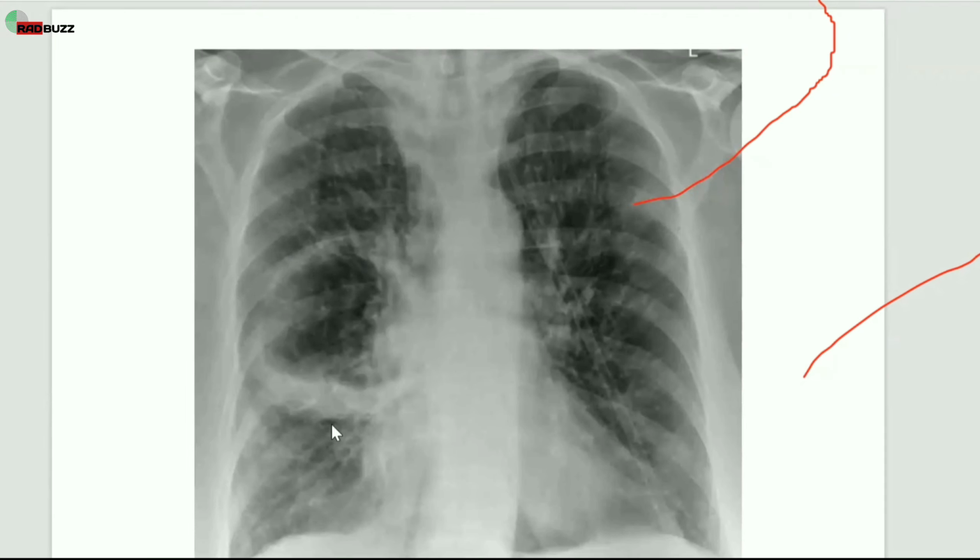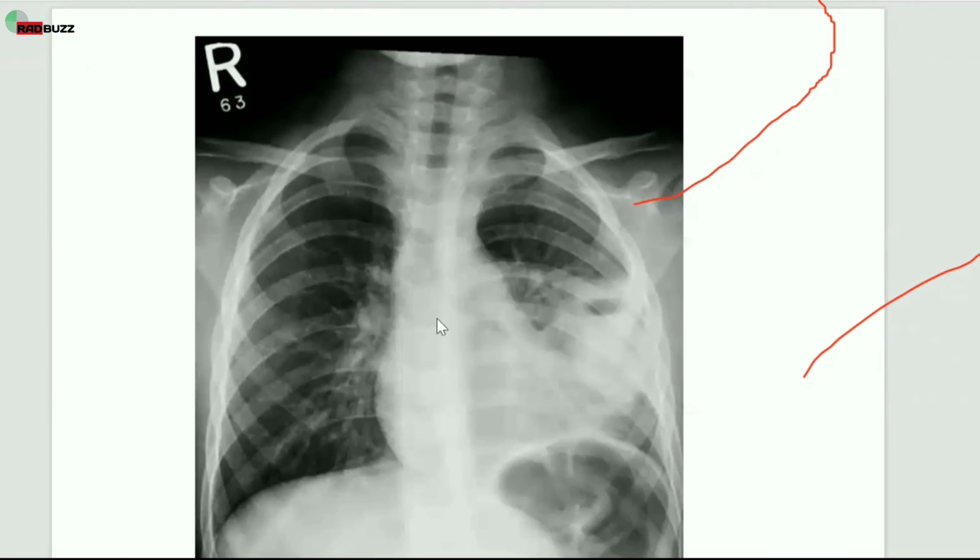Here we have again a well circumscribed lesion. We can see thick walls, and there's an air fluid level within it. An abscess will give the same appearance. They can be big. This whole lesion is an abscess, and we have a smaller internal air fluid level. Peripheral walls are thick, more of pus, and a small air pocket within it.